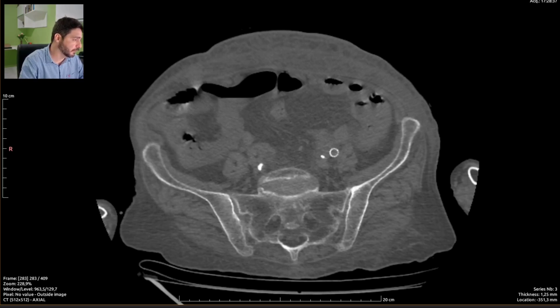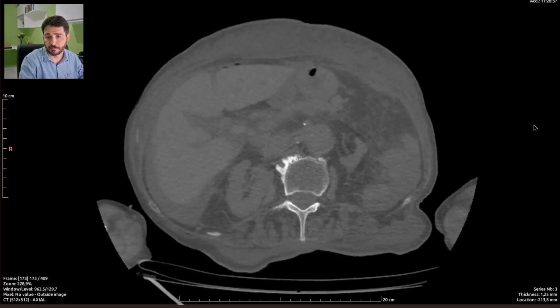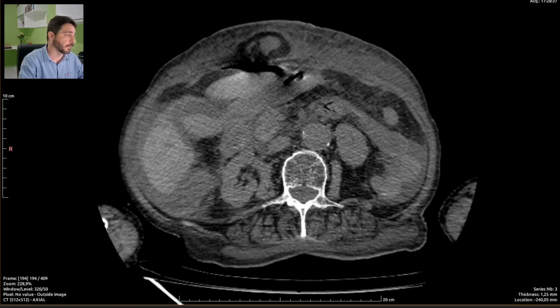So we're done. And lastly, let me remember. Now, there is this ventral herniation right here. And we finally reached the end of this report. Now let's summarize it.